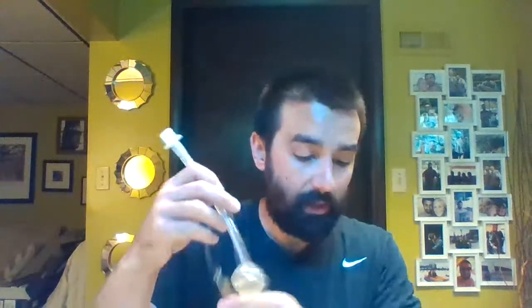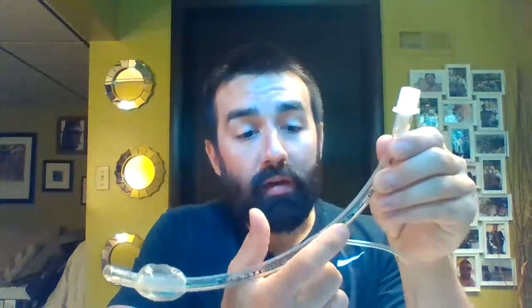That being said, these things are notorious for getting stuck in our equipment and coming off. So when I do an intubation, when I'm checking my ET tube, general rule of thumb, I'll push that thing down to make sure it stays put. We'll address what to do if you have a hub that keeps popping out on you at a later time. I'll do another video on airway troubleshooting and everything. So, 15-millimeter adapter.